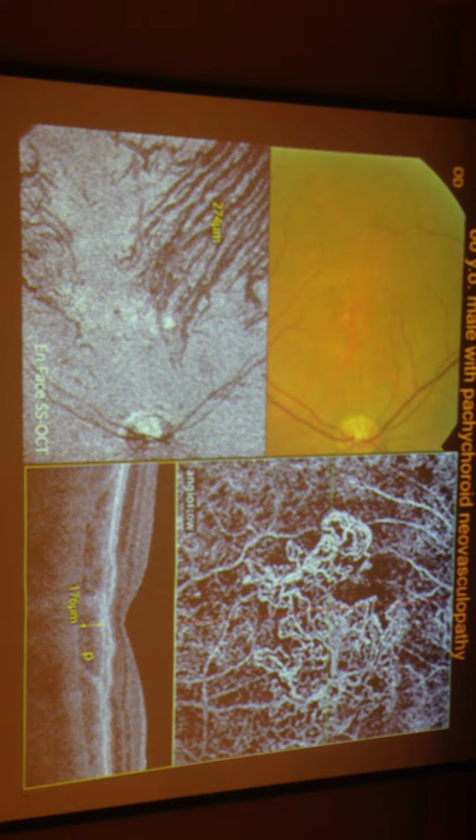Sometimes we put the dye in ICG, but it does not show the polyp. Maybe the polyp is gone, or degenerated, showing only the BVN. Yeah, but also on the OCT, if there are polyps, you would see the circular elevation of the RPE or polypoidal loop. But if there's no polypoidal lesion, then you wouldn't see that.